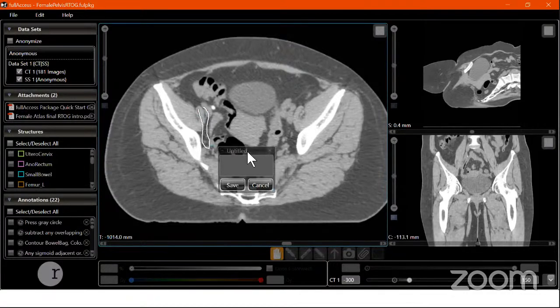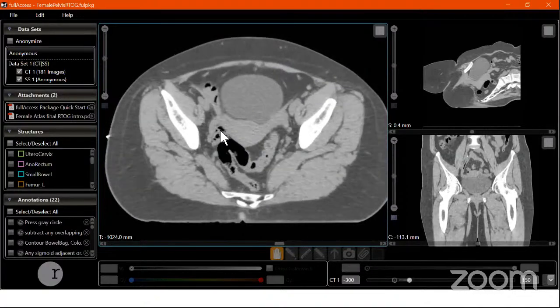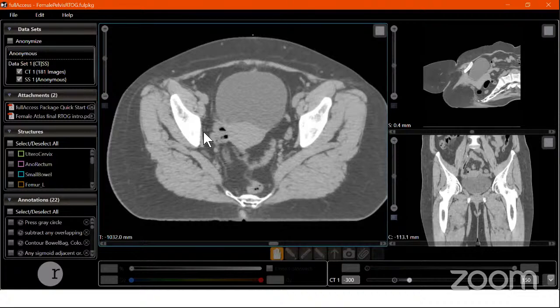So this gap obviously has to exclude the muscles, the obturator internus on the lateral side, and the pelvic structures on the medial side, any bowels or any other spaces. So this potential space which is lying here is the space for the obturator nodes.